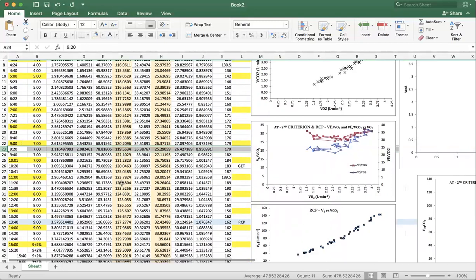And now we're looking for an increase in these two columns, our VE over VO2 and our PET-O2. So let's take a look. It's important to look for a pattern of increase because you'll see that each 20-second average is going to be slightly different. So starting with PET-O2, we have 119, 120, 119, 122, 121, 120, and then we see a jump to 125, 123, 122, 123, 124. So right around here, we see all of our values are above 120. There's a pretty obvious jump there.